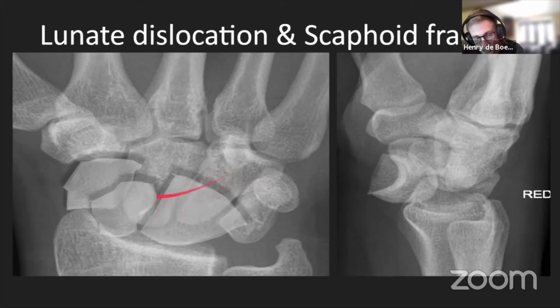Okay, so that's showing these carpal bones are just completely not normal. Particular injury mechanism? They are usually simple falls onto outstretched hands. There's not a particularly classic mechanism, but fall onto outstretched hand, I would say, from what I've seen, is the most common.